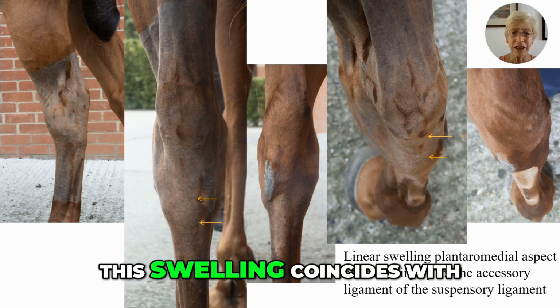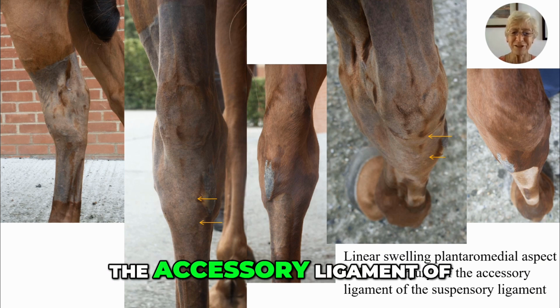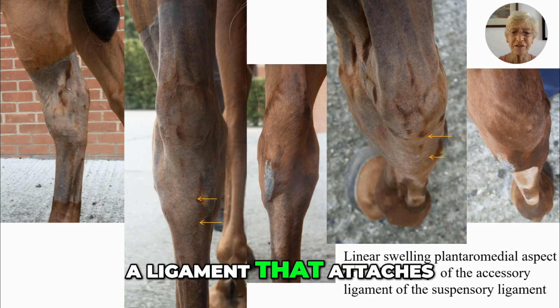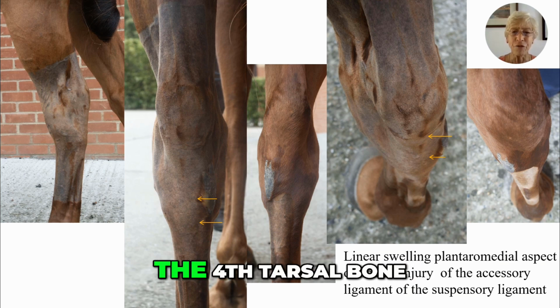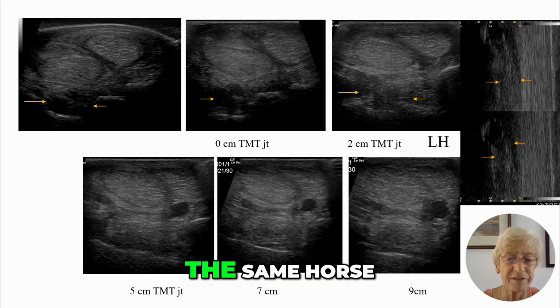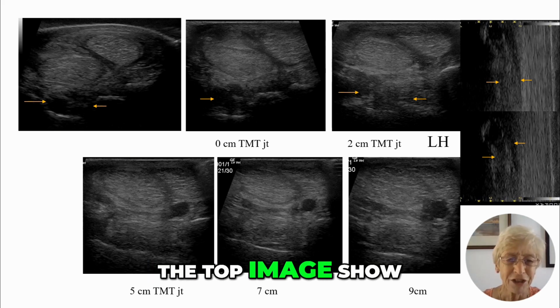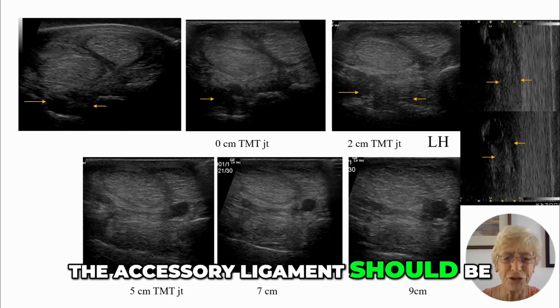This swelling coincides with the anatomical position of the accessory ligament of the suspensory ligament, a ligament that attaches to the plantar aspect of the calcaneus and the fourth tarsal bone. So here we can see ultrasonographic images of the same horse. The yellow arrows in the top image show the anechogenic space where the accessory ligament should be.